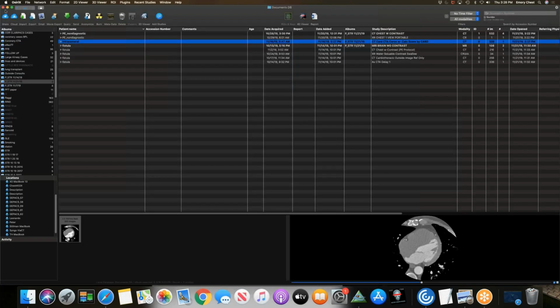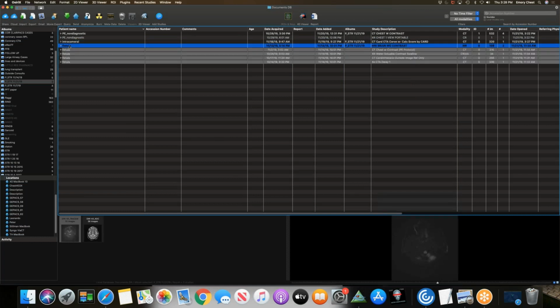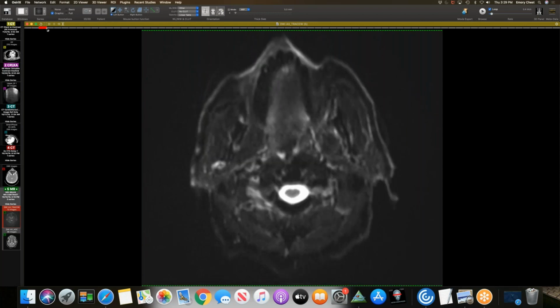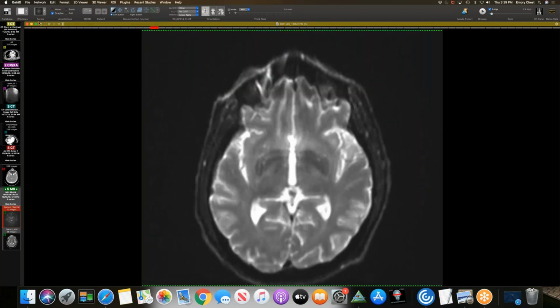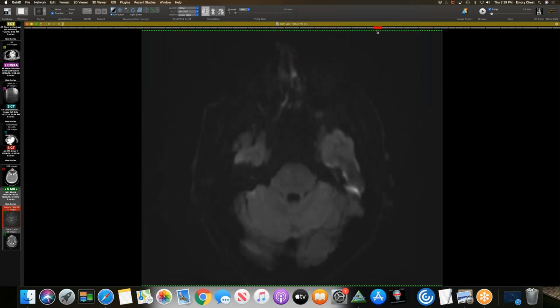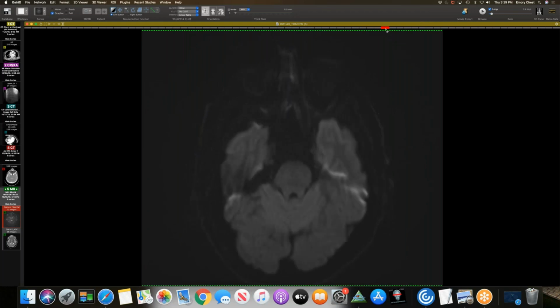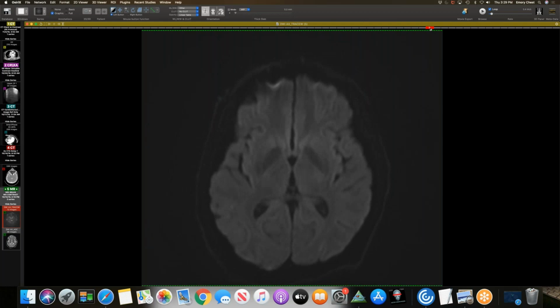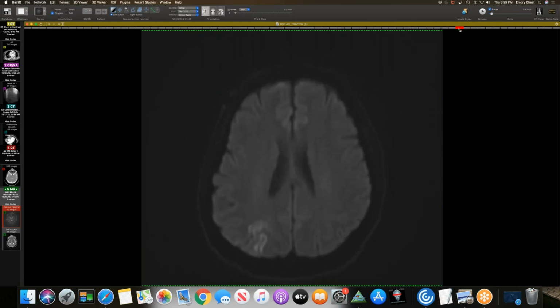All right. And one last one. Travis might appreciate this one. So this patient first came into the hospital earlier last month for multiple falls. So they did a brain MR, and here's the diffusion weighted imaging. You can see he has multiple areas of restricted diffusion in different small foci here, so in different vascular territories.